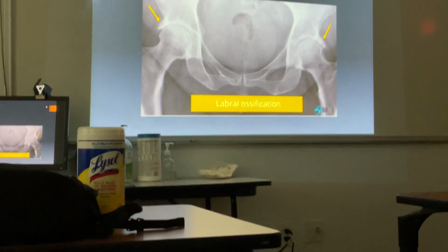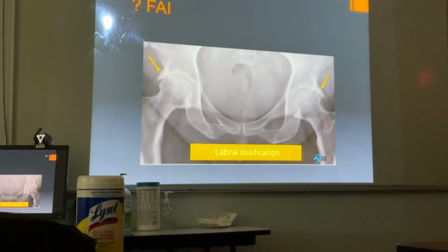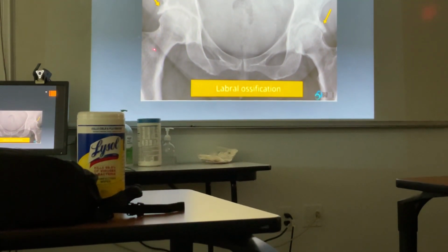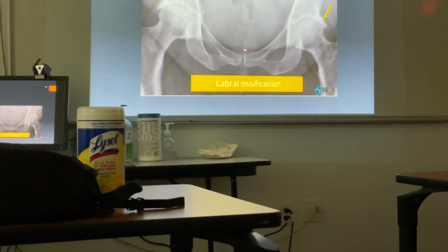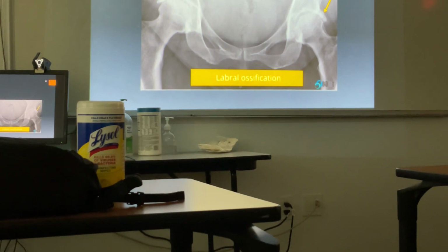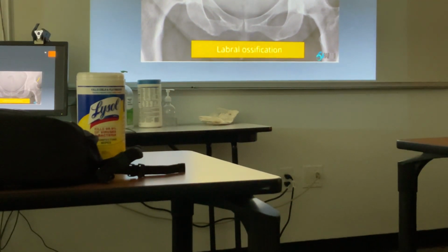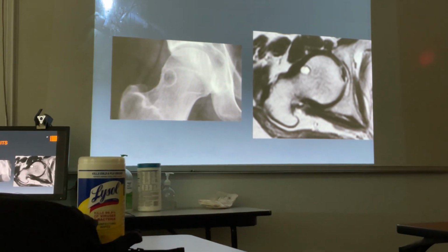Unilateral or bilateral, it just depends on what you x-ray. So in this case, this is where the yellow arrow is abnormal. There's also something abnormal here, a normal variant, and another one on this side. And look at the difference in discrepancy between this obturator foramen and this one. I see that so often, I just wonder what it means. I'd be curious to see how the patient presents clinically. Not normal, depending on the activity.